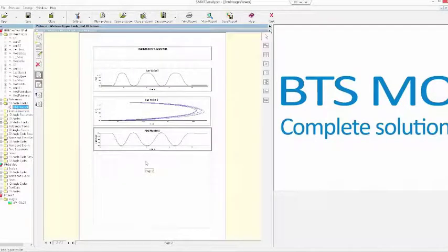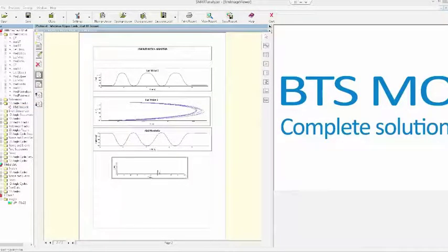Now I also want to add the graph about the mean cycle normalized into the cycle time domain. So again, I can add another box for the new graph. This angle should be within the folder 1D angle cycles.